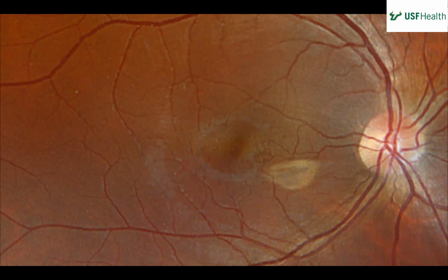All right, so go ahead. If it's above the vessels, then you do that. Okay. You're using monocular clues. He's gonna give you an OCT or something and then you'll know. So I think you described it well. It's smooth, it's about half or a third disc area, and then it seems to be mostly retinal. You forgot one important characteristic.